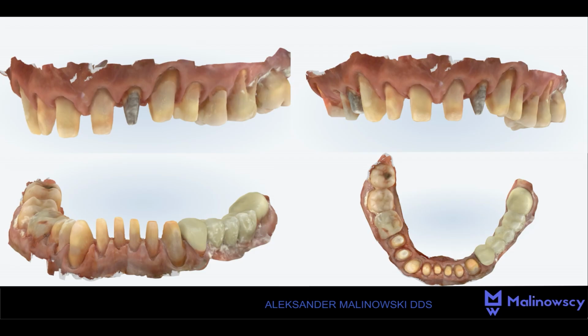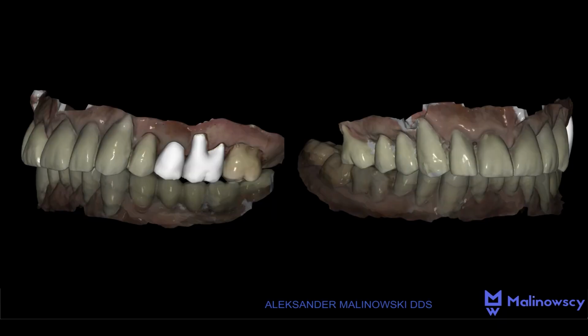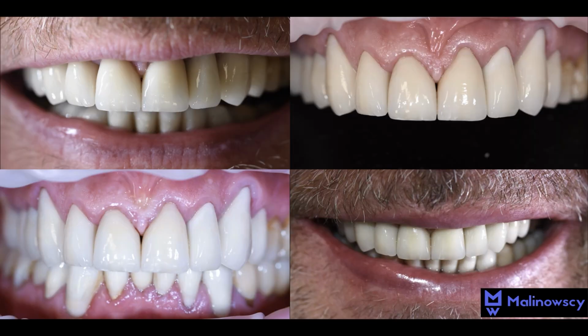Okay, here we can see the intraoral scan and the photographs made by my friend Bogdan in the laboratory. Okay. On the left down corner, you can see the condition a month after delivery of the work.